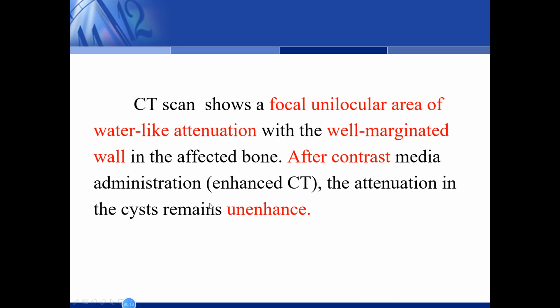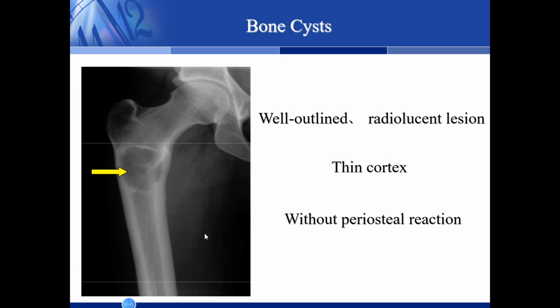CT scan shows a focal unilocular area of water attenuation with the well-marginated wall in the affected bone. After contrast medium administration in enhanced CT, the attenuation in the cyst remains unenhanced. We will see some cases.